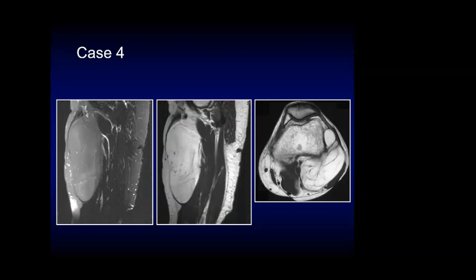It may be lipoma, it may have a lipomatous major component, as I think. So, is the fat inhomogeneous? There's slight inhomogeneity at the lateral aspect or posterior aspect. You mean this one? Yes, yes. Oh, so this is subcutaneous fat, it is not in the tumor.